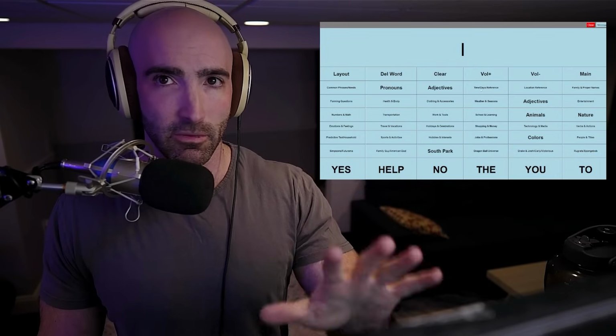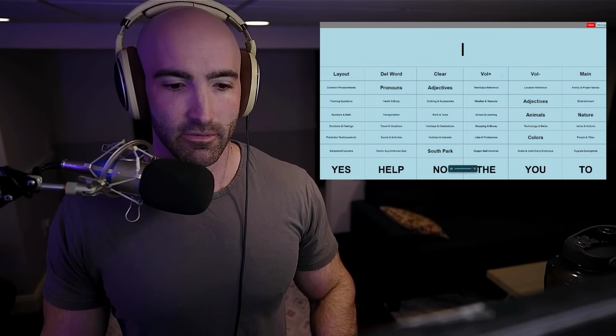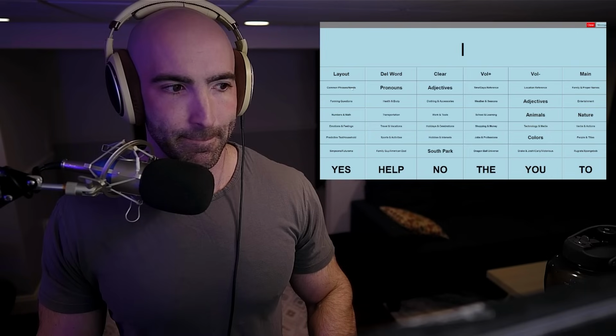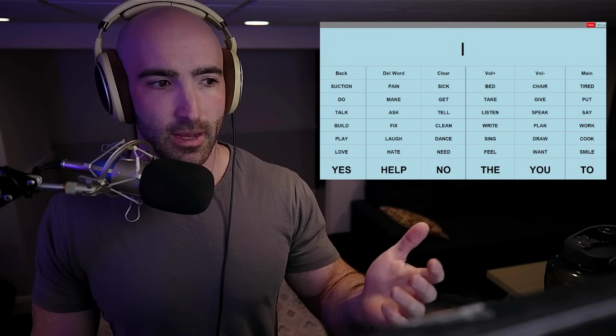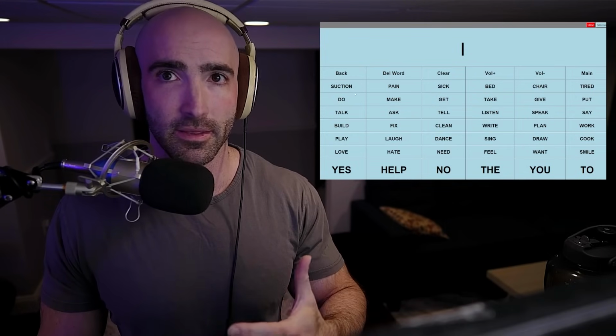So I wanted this to be robust, not just for Ben, but for anyone who is going to use it. The volume up and volume down feature increases and decreases volume, as you can see. Yeah, so we added something called common phrases and needs on this one as well. So if he needed something from here, he has like 30 some odd things to choose from.